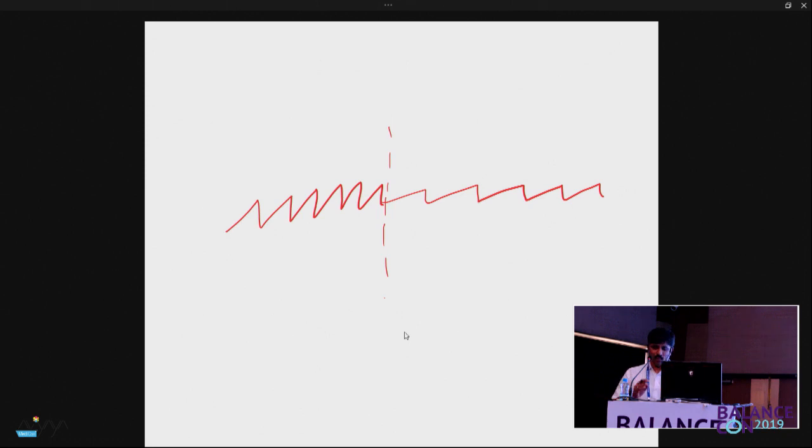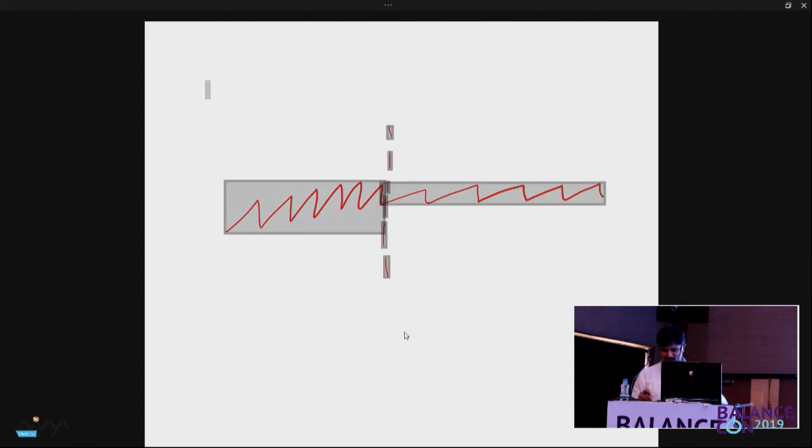Next is even more important. Go back to the next page. Optokinetic gain saturation limit. Look at this particular person. The first graph shows, are you on this page? Optokinetic gain saturation limit, all of you? Yes, thank you. Ma'am, you have a question? Or you said yes? Yes, thank you.